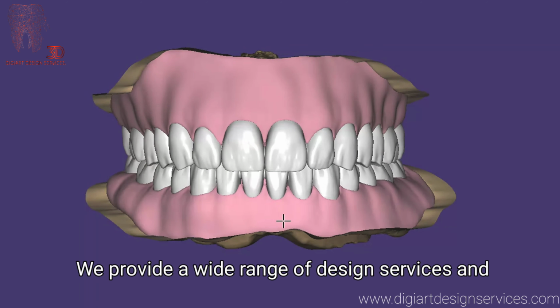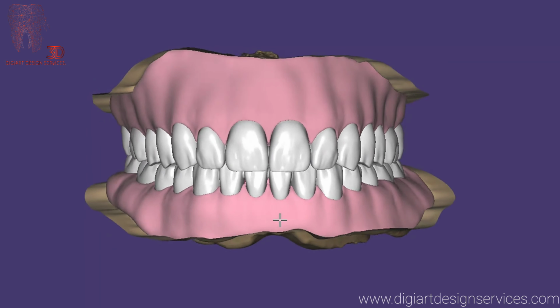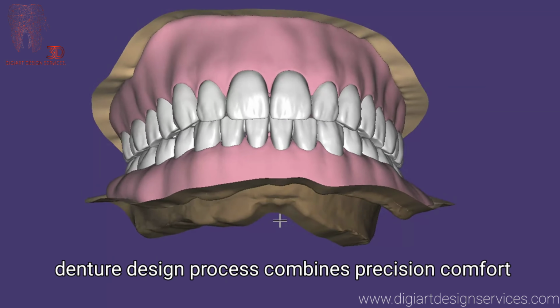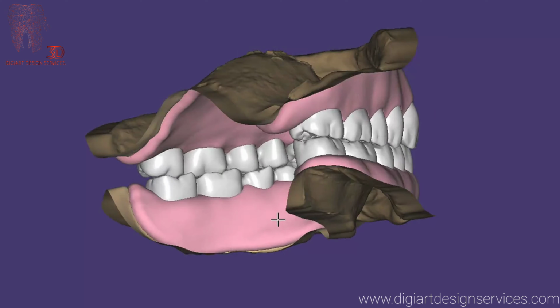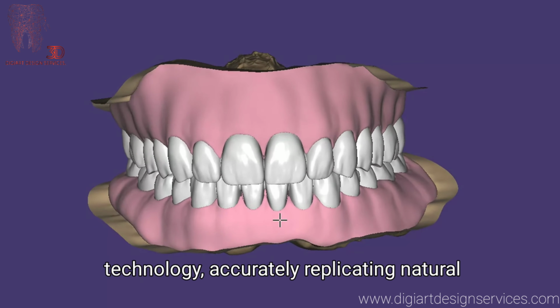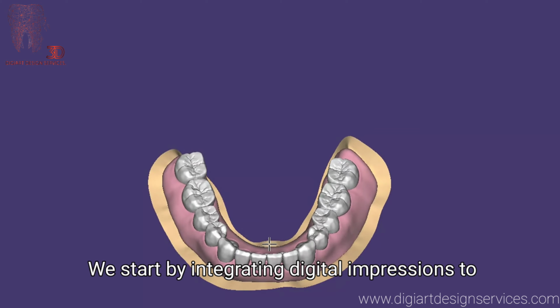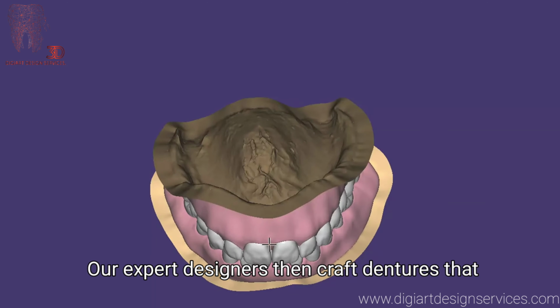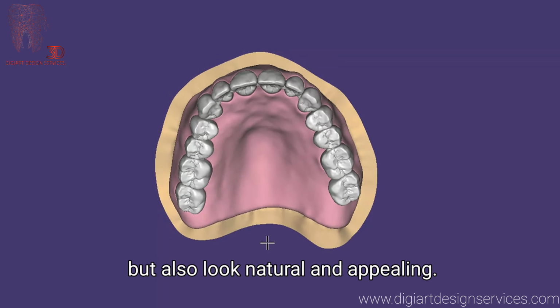We provide a wide range of design services, and one of our specialties is full denture design using advanced software. Our digital denture design process combines precision, comfort, and aesthetics through cutting-edge CAD/CAM technology, accurately replicating natural oral anatomy. We start by integrating digital impressions to create highly accurate virtual models. Our expert designers then craft dentures that not only fit perfectly, but also look natural and appealing.